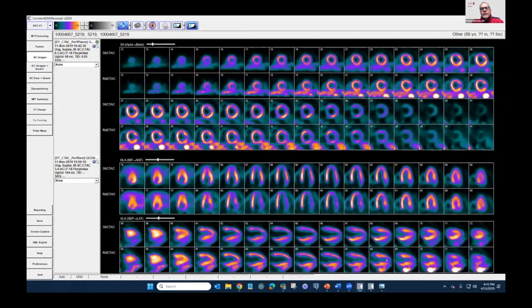And second, the attenuation misalignment, of course, most commonly observed in the anterolateral wall, because if there is misalignment, it needs to be corrected on the scanner console. This is something that your technologists will need to learn to do. And there's a learning curve there for sure. And so, sometimes it can depend on the diligence of the technologist.